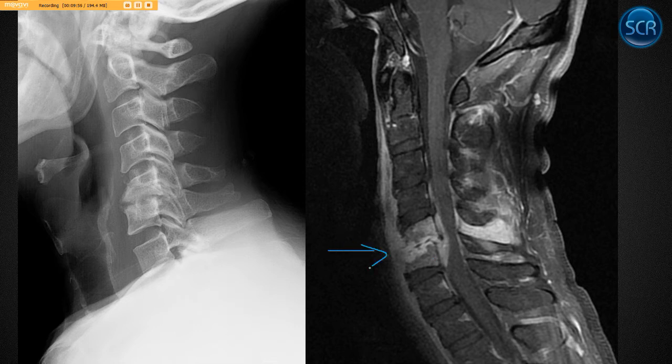We look at their MRI, which would be the appropriate follow-up, of course, with emergency medical consultation. And we can see that they actually do have a fair amount of prevertebral edema, but they also have extension of this infection with the epidural abscess and then a bunch of enhancing tissue back here. This is a contrast-enhanced MRI. So this person needs IV antibiotics and potentially a neurosurgical consult for emergency decompression, because you can see that the cord here is quite compressed.